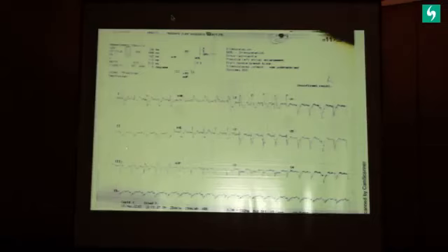But if you look at aVR, aVR is one of the neglected leads. If you look carefully at aVR, we see there is an ST elevation. And the other thing that is remarkable is you see some kind of an ST depression in V5, V6, and there is sinus tachycardia. So this all indicates that something is brewing. Now this right bundle branch block could have been in the past, and this may not be a new phenomenon, but it could be a new phenomenon. But this ST which is going up in aVR does connote something that we must look into.